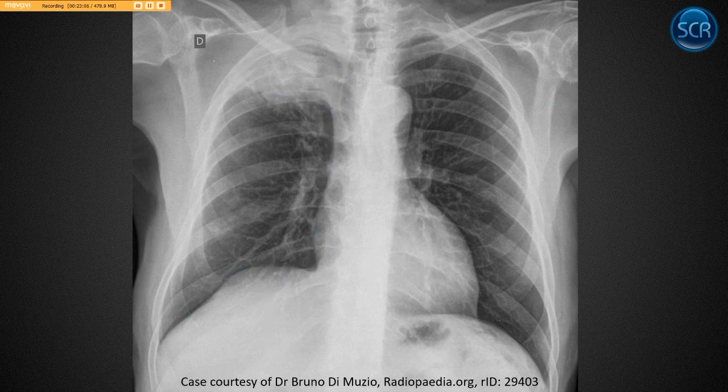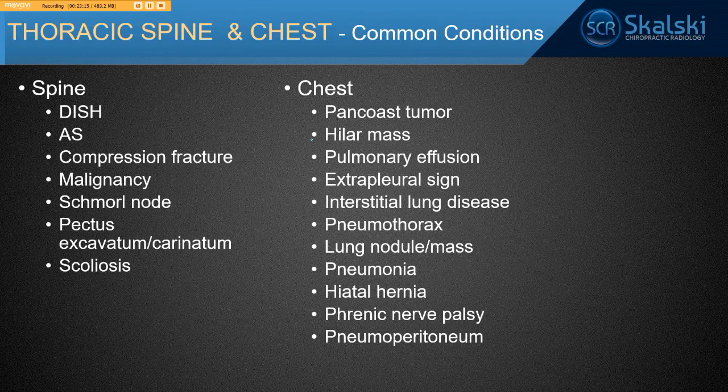Okay, so that's something else to look for. You can have phrenic nerve palsy from other things, right? It can be surgical or any other number of reasons. All right, so that's a good transition into chest. So I'm going to stop this video and record that separately because sometimes when I record too long, the timing of my audio with the image gets off.